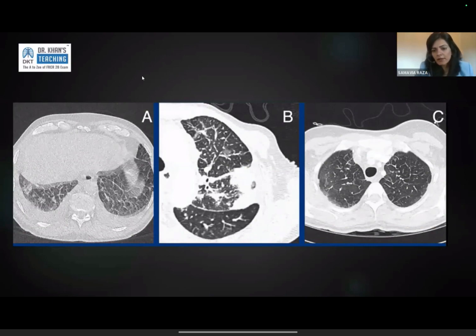Okay, let's go through what you guys have said. So Shima has said A has effusions, absolutely right. So the patient in A has bilateral pleural effusions. Then they have this septal thickening at the lung bases. So what do you think that is? That would be fluid overload. So that wouldn't be ILD.